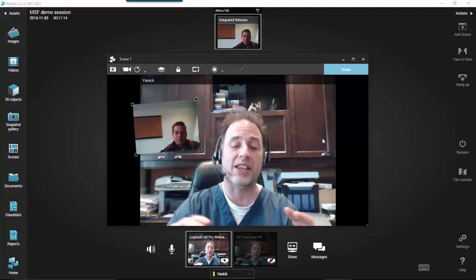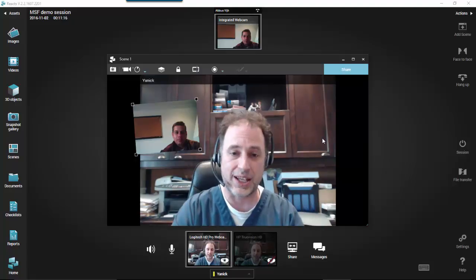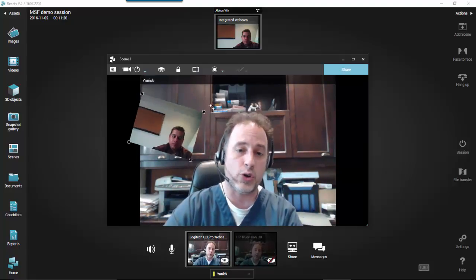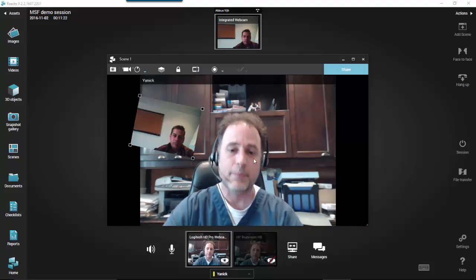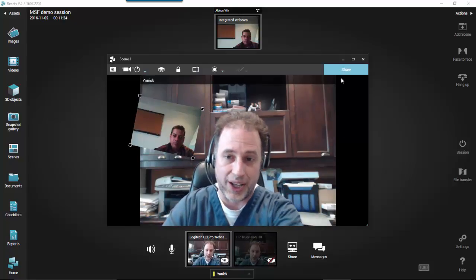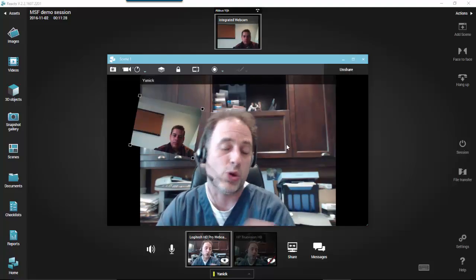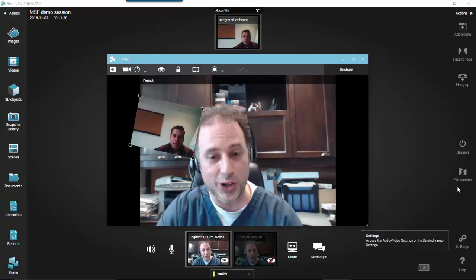As long as you don't share the scene, the other user doesn't see it. So it allows you to put whatever you want in it so that it appears fine. And when you're ready to show your scene, you hit the button share. And now you'll see that blue bar on top. So you know it's being shared. So now I'll just see the scene.